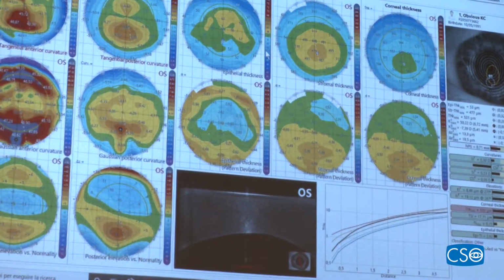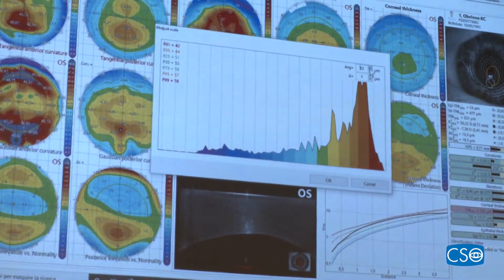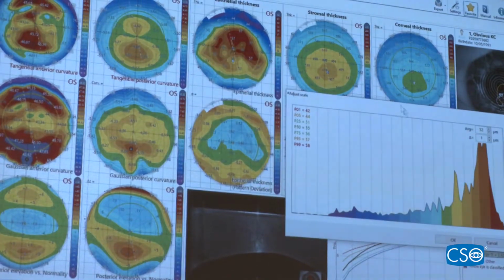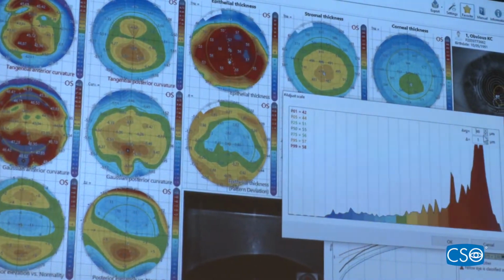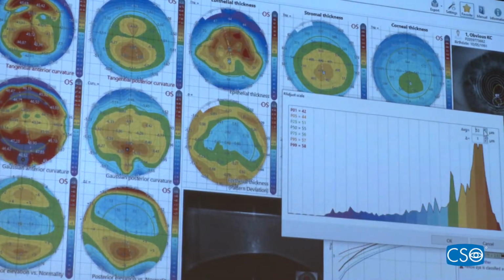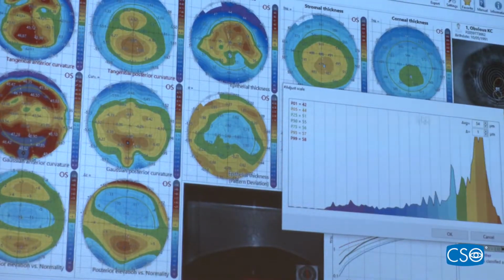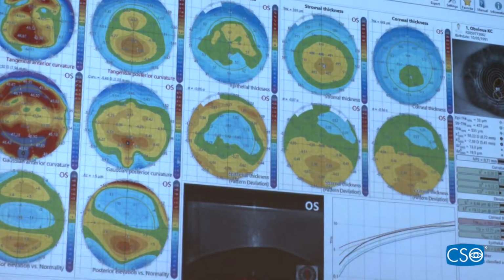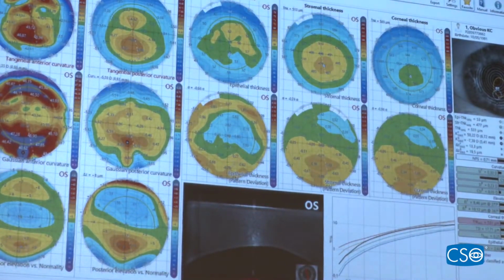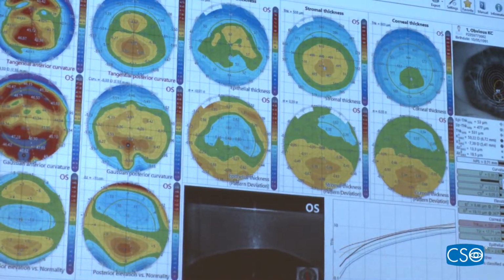So, again, we normalize the scale here and adjust it so that we can emphasize any irregularities, and I don't think I can. That looks okay. Well, maybe here, you see, maybe here, okay? And now I'm looking on the horizontal lines. Oh, sorry, I didn't finish.